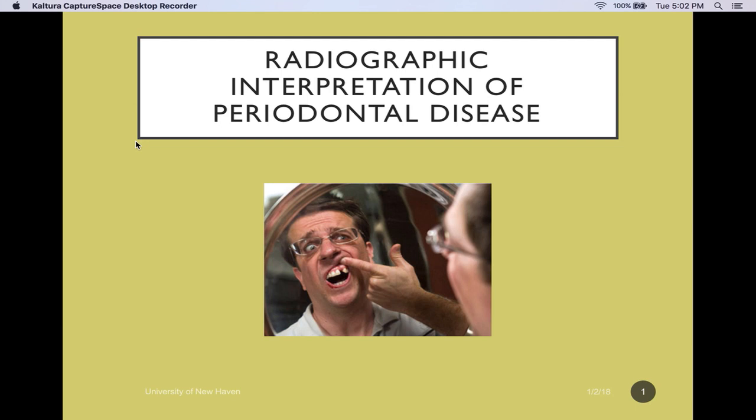All we're looking at today is just the periodontal disease cases referring to the bone loss that you can see radiographically, and we'll discuss the different components when making that periodontal disease diagnosis. It's important to remember that when you're making a periodontal disease diagnosis, one of the things that you've already used in clinic is your periodontal charting. You've done probe depths, clinical attachment loss, mobility, furcations, and bleeding on probing. The other important factor, and probably one of the main components of periodontal disease, is the loss of bone. Radiographically, we can use your radiographs to look at how much bone has been lost in certain areas.